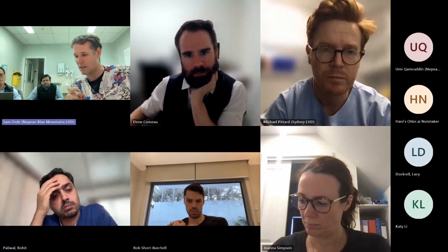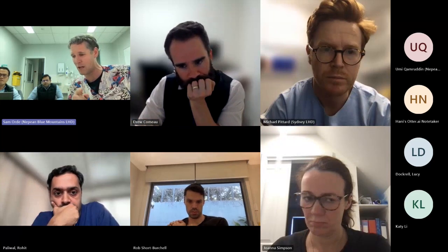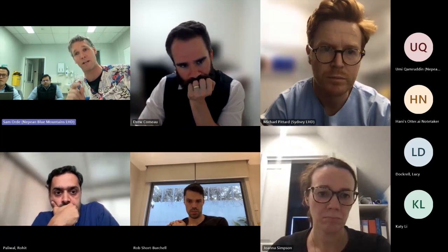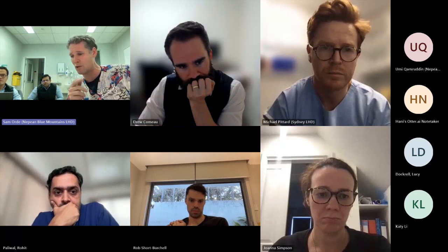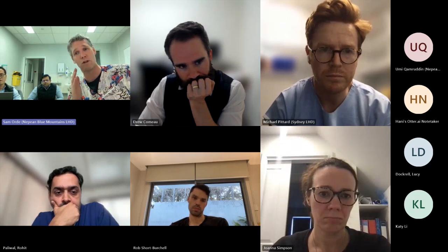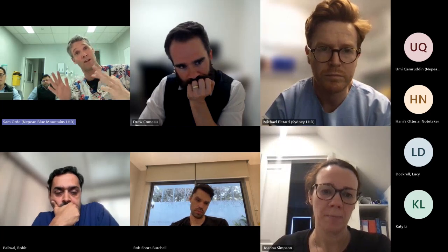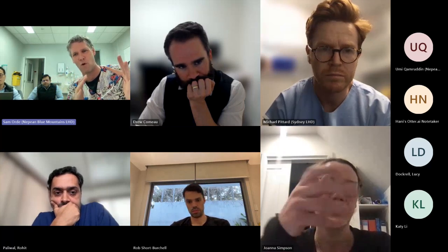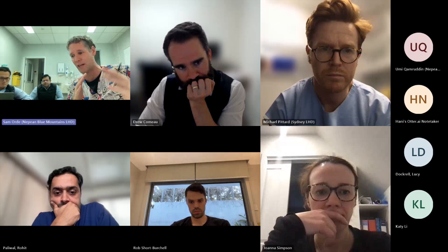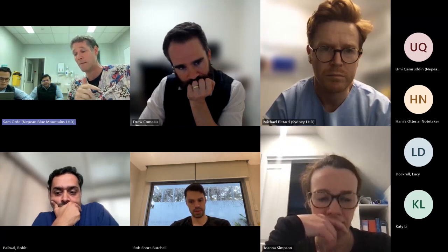You did something really nice in that, which I wanted to talk about. I forgot to do it for Joe's one on the last one. You talked about the severity of the mitral regurg in the clinical setting, which is this guy being on some catecholamines. In the last one, Joe, I forgot to mention, you talked about a normal contracting left ventricle, but we forgot to mention that he was on truckloads of catecholamines, wasn't he? He was on noradrenaline, vasopressin, and dobutamine, I think. So in that setting, the heart should be beating much faster.